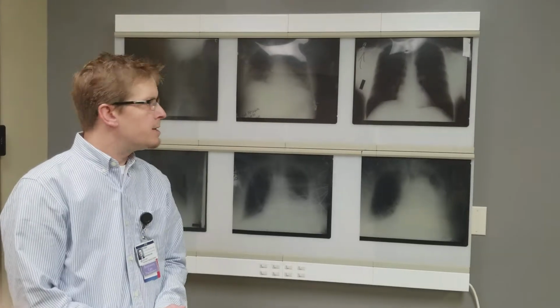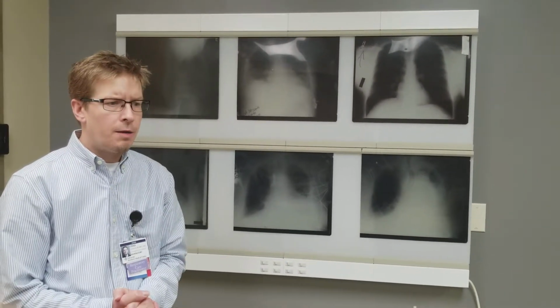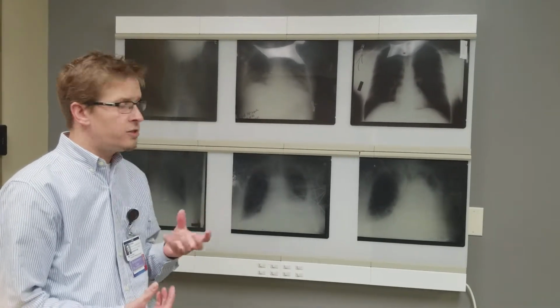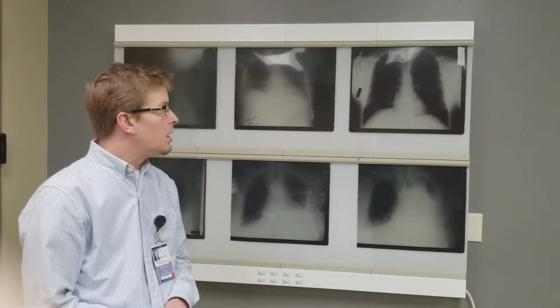Right. This is basic chest X-ray interpretation. A disclaimer, I'm not a radiologist. I'm a respiratory care practitioner. There's a lot to know about these things, and this is just a basic aspect of a few things that we use at the bedside. So this is a bedside clinician's approach to some things that we can learn by looking at these films.